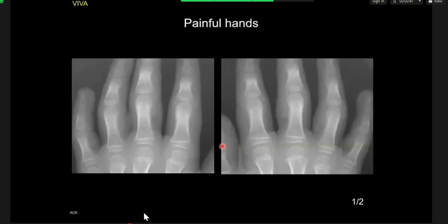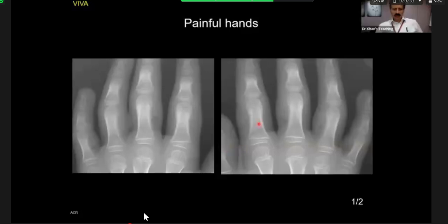I think these show periosteal reaction at the lateral aspect of the proximal phalanges, fairly symmetrically. Excellent. I'll take over. Well done. So if you can see here, periosteal reaction, periosteal reaction, periosteal reaction. What can be the cause? Over to you, candidate 2.